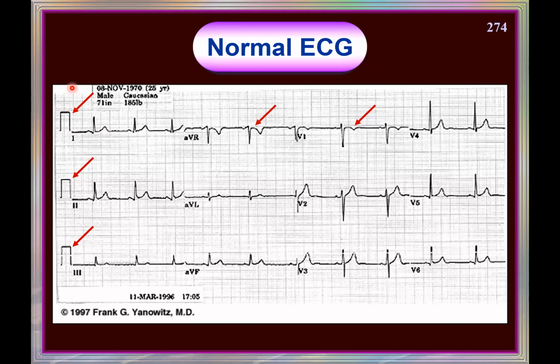Then it has to be marked in red. It is half standardization. If it is marked here as half standardization, and this is 5 millimeters, then it means it is originally 10 millimeters because I have reduced the standardization.